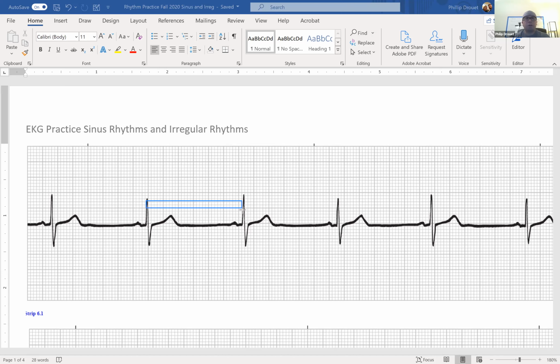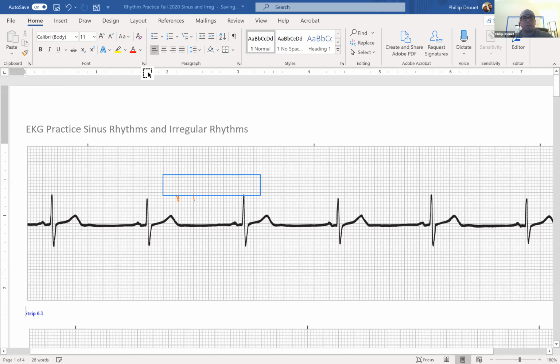So I'll measure from there to here. Because I have this great technology where I can move this box a little bit, I can adjust my measurement just a little bit. I'll line it up against the heavy dark line there, and I have 5, oops, let's do this again. I got 5, 10, 15, 20, 25, 30, 31, 32 small boxes. 32 small boxes.